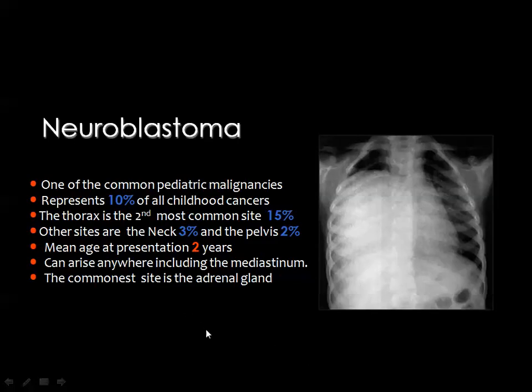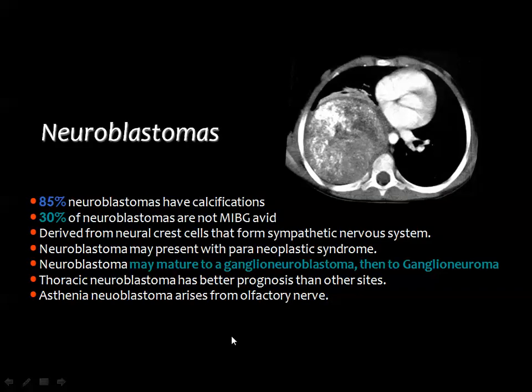after the adrenal gland. Neuroblastoma is a big mass in the posterior mediastinum, and one of the clues for being a mediastinal pathology is the compression of the lung, meaning that this lesion is outside the lung, compressing the adjacent parenchyma. Calcium is present in neuroblastoma and detected in about 85% of cases by CT. And neuroblastoma may have an extension inside the spinal canal.